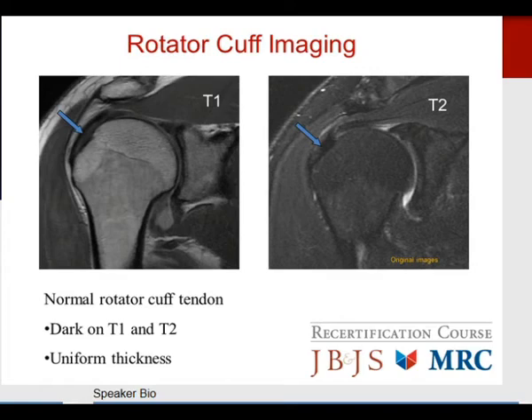The rotator cuff, the musculotendinous junction, typically sits in the 12 o'clock position when we're looking at the MRI in the coronal imaging plane. And then as you move peripherally, as the tendon comes over to insert into bone, it should just be a uniform thickness, uniform low signal, which extends right down and then attaches to the uniformly black cortical line. So this is the normal appearance of the cuff.